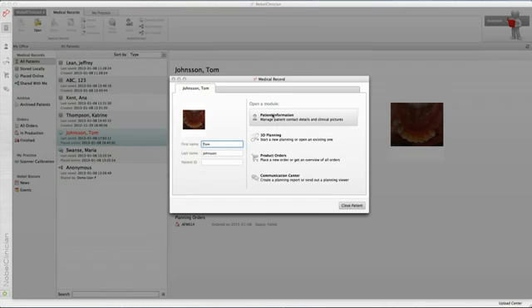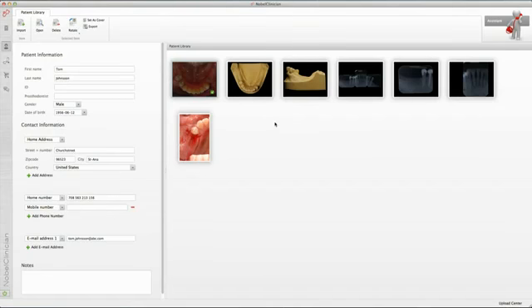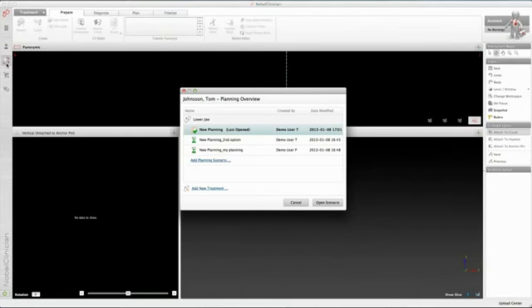When Patient Information is selected, a screen will appear which may be filled out with the patient's information and contact details to the clinician's desire. Also, images like clinical pictures or X-ray images can be added and annotated here. All added pictures can be shown together with the 3D patient model during the 3D planning step in the specific workspace. From this screen, you may select the planning icon from the far left sidebar. All information in the patient information section is automatically saved.